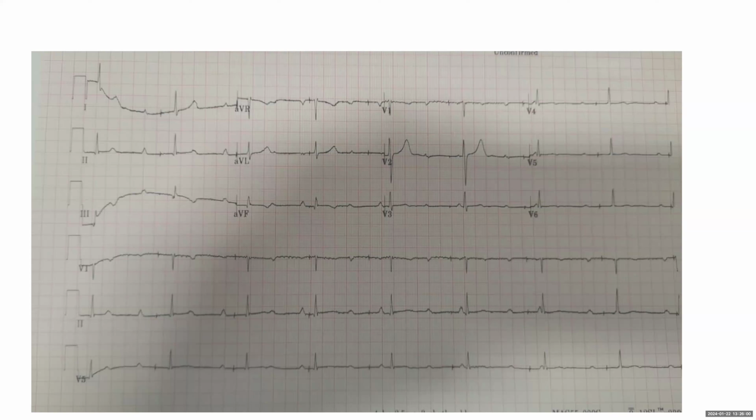You actually cannot tell, probably V because it's single, but because it's not capturing, there is no history, there is no chest X-ray, technically you cannot tell. But I would go with the V because, again, we rarely implant only a single lead in the atrium. Yeah, so what to choose? I would choose the V. But I don't think anyone can fault you, but from the ECG point of view, you cannot tell because there is no capture.